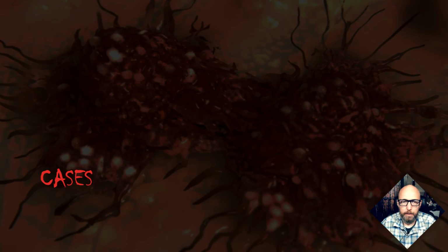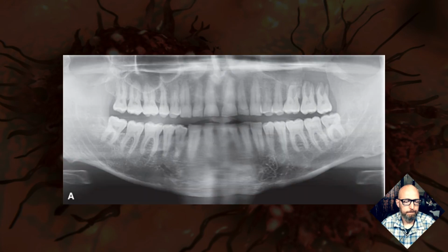All right, for the next few minutes, if you're interested, I'm going to go through a few cases. I'll give you a second to look at them. Maybe pause the video on the slides when you see them and see if you can come up with a diagnosis, and then I'll discuss them briefly. So take a look at this one, pause the slide.